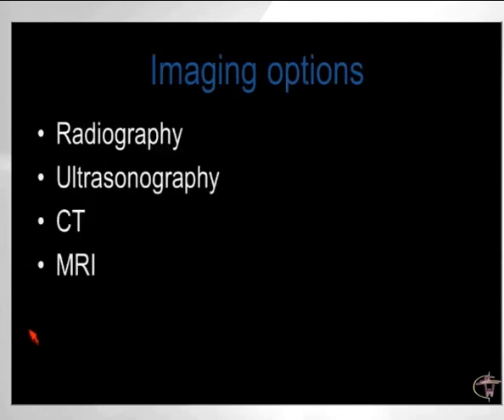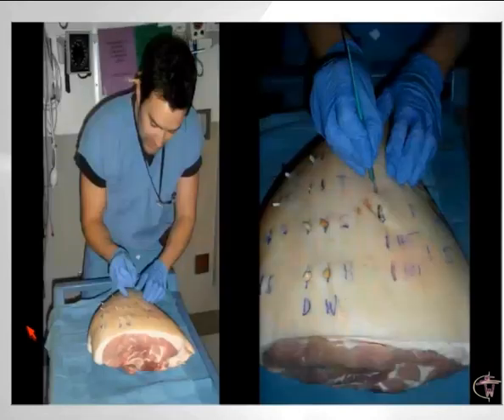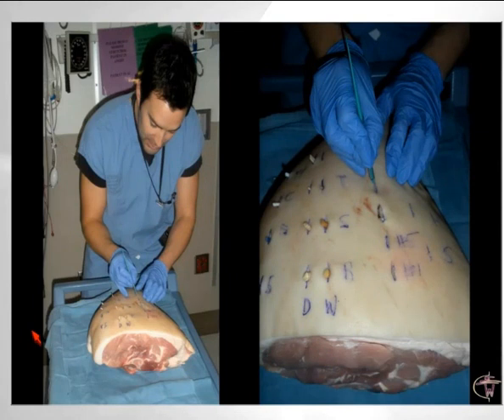When we think about foreign bodies, we also always have the armamentarium that we usually have at hand, including radiography, sonography, CT, and MR. So what's best? To get to the bottom of this, we went to the butcher store and bought a ham, and then my colleague Chris Ingram, who has a surgical background, spiked this ham with a defined set of foreign bodies and we sent it through the MR scanner, through the CT scanner. We looked for the foreign bodies with ultrasound and with radiography.